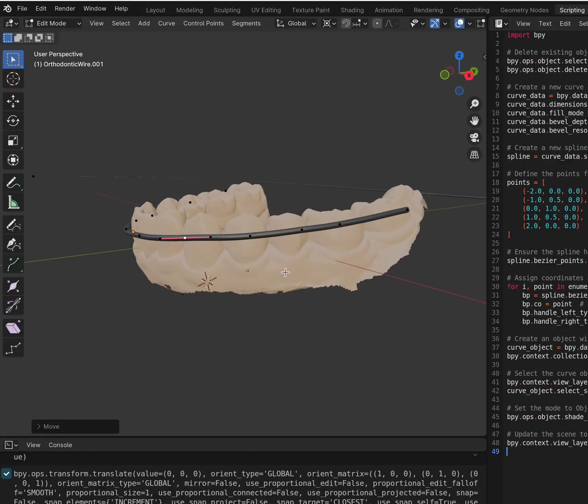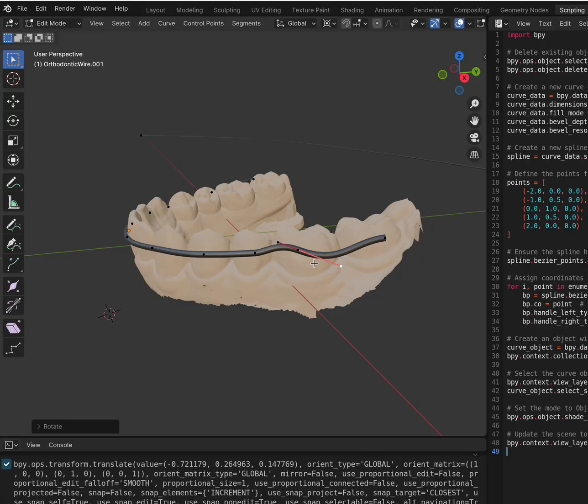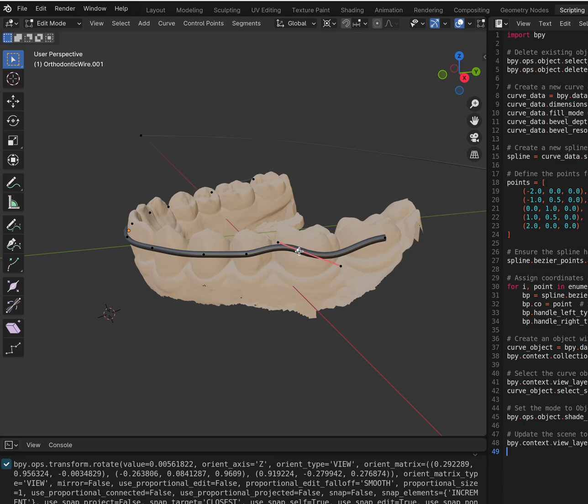You may want to do a little bit of rotation to engage them. And again, it's a round wire that is a little bit oversized just to show you. So you can also decide that you want to make a little bend in this wire here to make it somewhat different. You can do totally what you want.